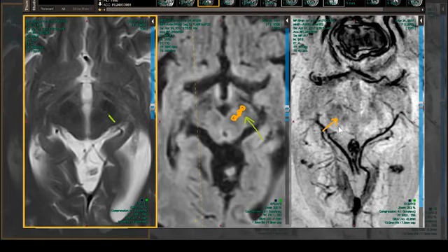And they typically don't bleed in the brainstem. It's often a bleed within a bleed. So they bleed, and then they bleed into that bleed, and then it resolves, and then they get another one in another location, and they end up with all these little punctate hypointensities. By the way, don't confuse those with calcification. There are some techniques that you can use in phase, out of phase imaging to differentiate microcalcification from iron. We'll talk about that later. But the easiest way, obviously, is to just have a CT on hand, and you'll be able to tell right away.